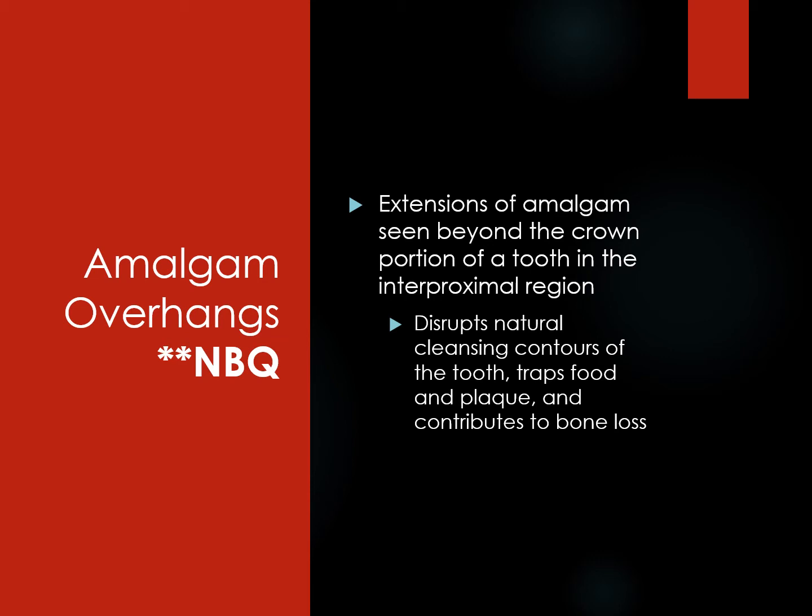Now, overhangs can be made of other types of material too. We can do it with both composite and sometimes a crown. The margin won't be perfectly flush, and it will cause the same problems as this. Amalgam was a little bit more common that we see these filling materials have this problem because of how prevalent the material was. They were using it a lot, but also because amalgam is very time sensitive. It cures very quickly, and so a dentist doesn't have a lot of time from the time that the amalgam is mixed to the amount of time that they have to get it into that tooth.